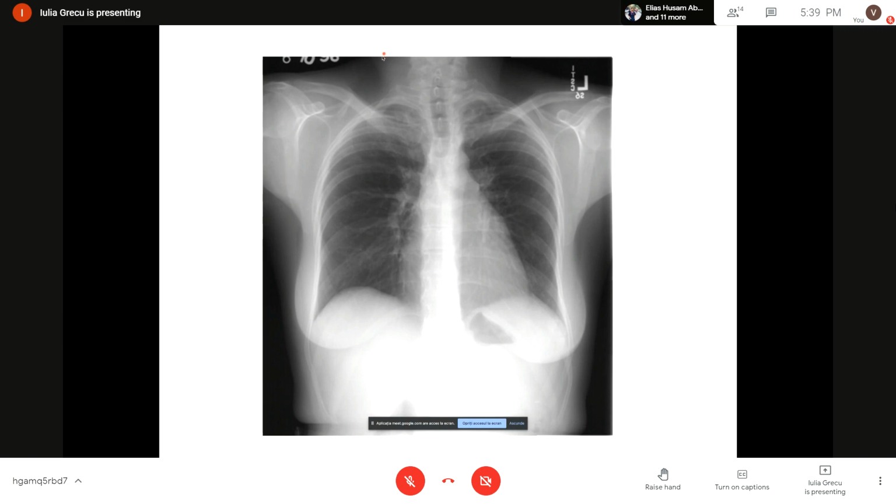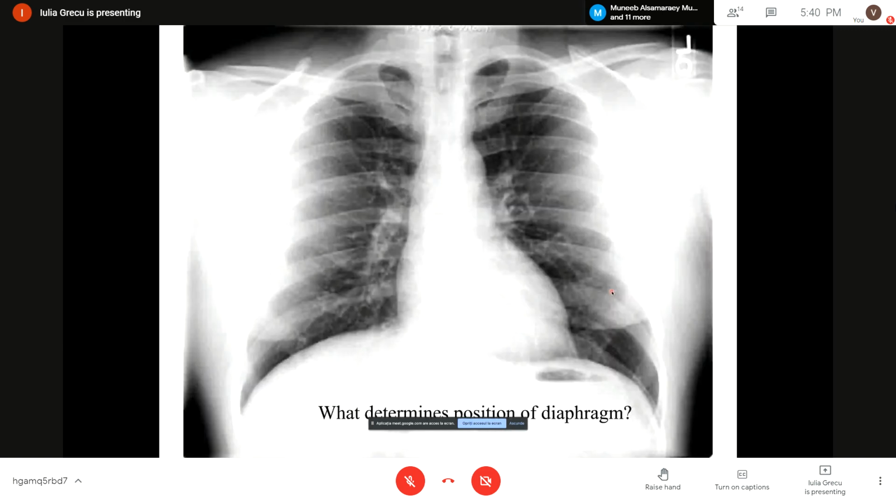We also catch a bit of the inferior cervical area, so we have to look here too, also formed by soft tissue like muscle, skin, and fat. And this is the normal aspect of the soft tissue and the normal aspect of the breast opacities. Okay.